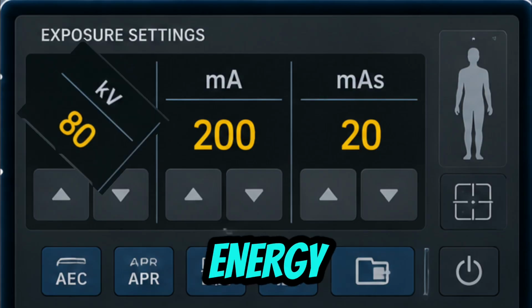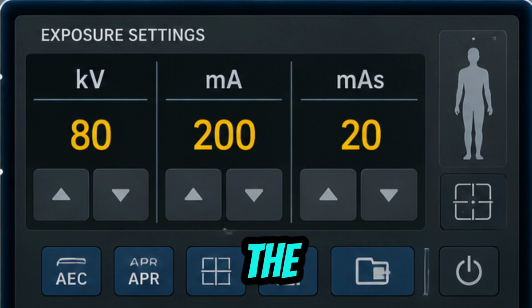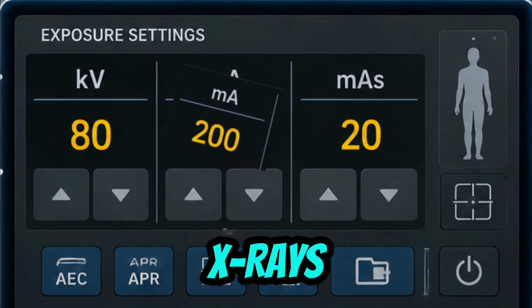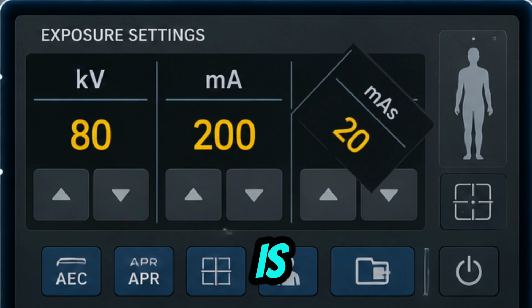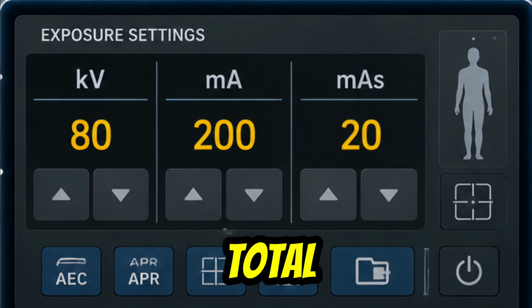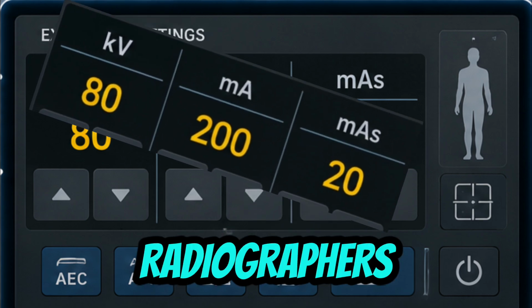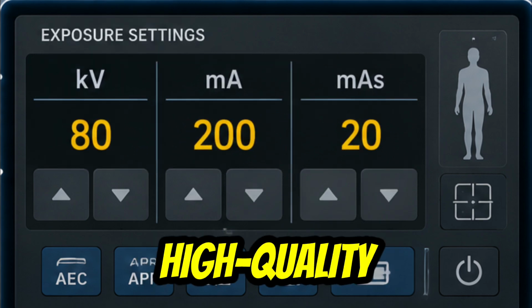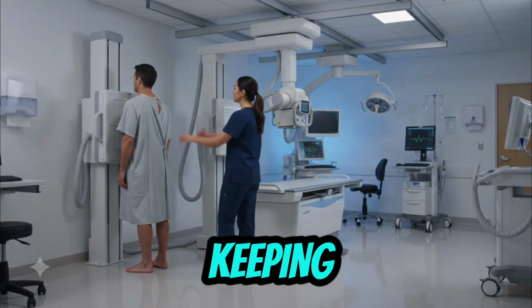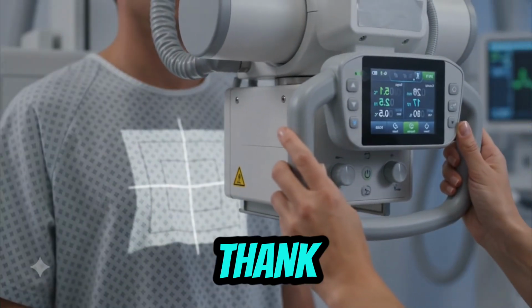kV controls the energy and penetrating power of the X-ray beam. mA controls the tube current and the quantity of X-rays produced. mAs is the product of tube current and exposure time, and it determines the total amount of radiation produced during the exposure. By carefully selecting these exposure factors, radiographers can obtain high-quality diagnostic images while keeping radiation exposure as low as reasonably achievable.